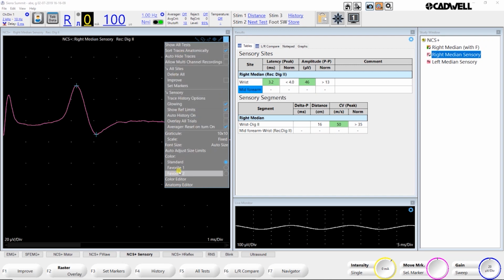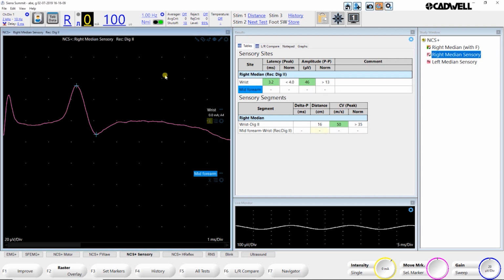And we won't get into that in much detail in this video, but this is how you set up all the different settings for the trace window, and again for the individual sites. Now in the site cogwheel you have some functions that are helpful. These are our different trace history options, so you can show all traces at the same time when you turn on trace history, 5 at a time or just 1 at a time.